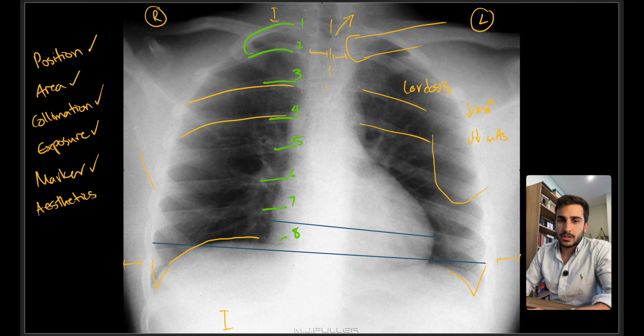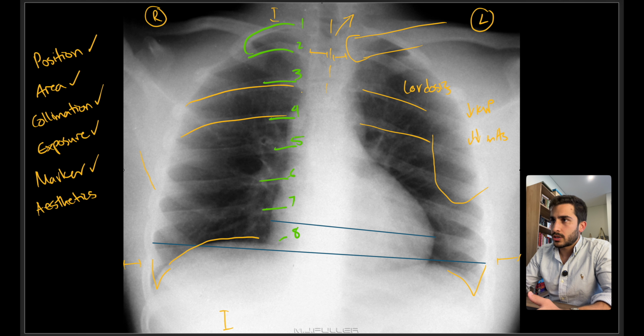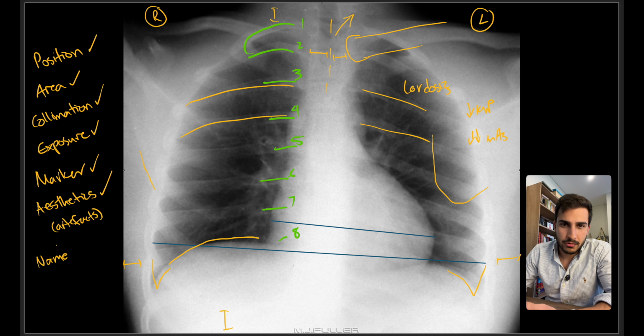Okay, terrible aesthetics, right? Doesn't really look good, both in terms of the lordotic nature of the patient, the poor exposure, and just the fuzzy blurriness lookingness of the image. So not the best aesthetics. Doesn't seem to be any artifacts either, right? So no artifacts seen in this case. So that's done. And the last one was name, right? So no name on this patient's X-ray or this file for anonymous reasons. So again, that one is the freebie.